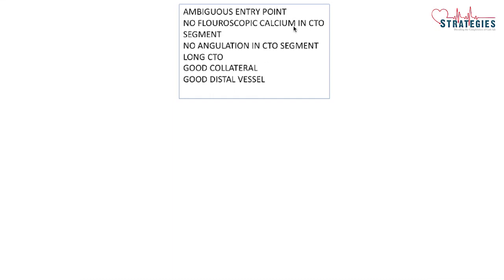So it comes to a JCTO score of 2 plus 1. The 1 is because it is a reattempt, already failed CTO. So overall the JCTO score is 3. So it would be a bit difficult case according to the JCTO score.